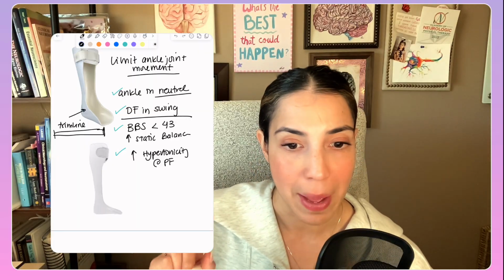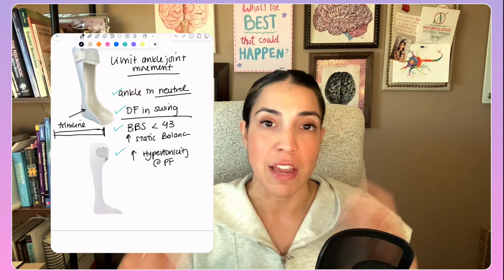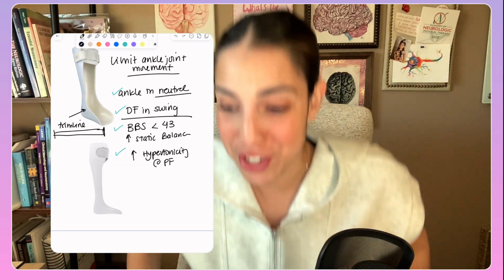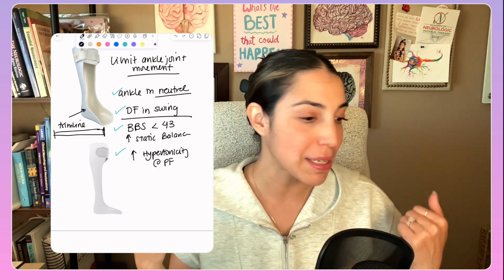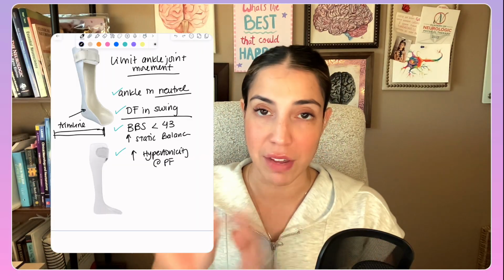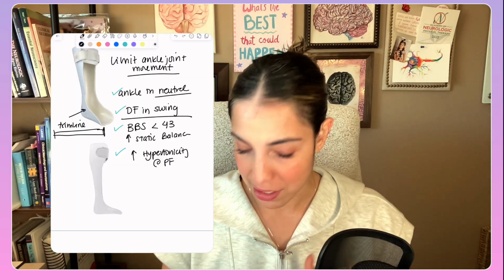Now, here's one thing that I need you to know and not forget. If you're going to say, I'm going to give my patient this AFO, and this AFO is going to help a lot with the tone, with the spasticity, I need you to understand that AFOs do not decrease the spasticity. It's not going to increase the spasticity. It's not going to decrease the spasticity. It's not going to magically make it disappear. So if you are giving them an AFO to help with the spasticity, it's not going to work. There is no evidence out there, and this is from the CPG of AFO and FES.